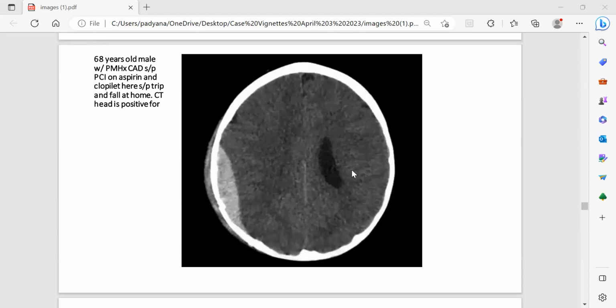Excellent. So now we will try to see, either you can use the index problem and then all the other problems, or you can go systematically. Extradural. One of you try. Right-sided extradural hematoma with a significant mass effect, isn't it?